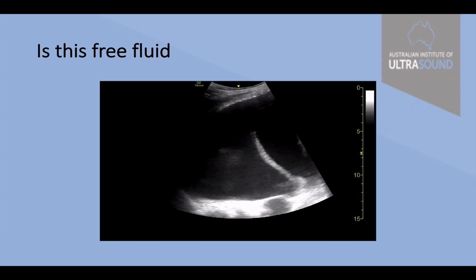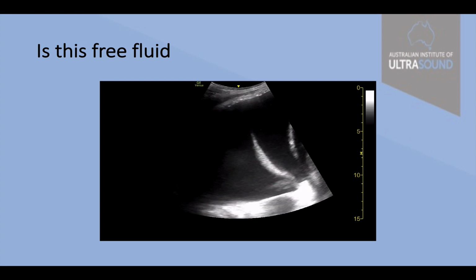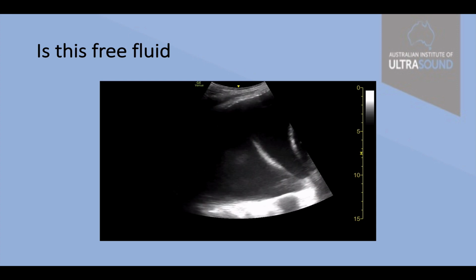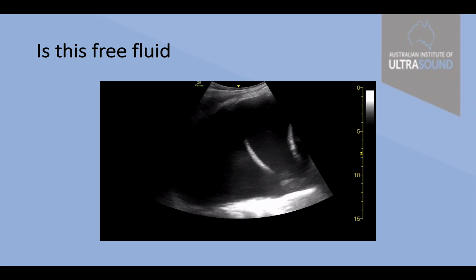Ooh, this is an easy one. This is the base of someone's lung. Again, diaphragm on the right, spine sign near the base, and that beautiful moving sliver of collapsed lung in the middle, moving quite autonomously, it seems. Well, not really, but it seems like it.